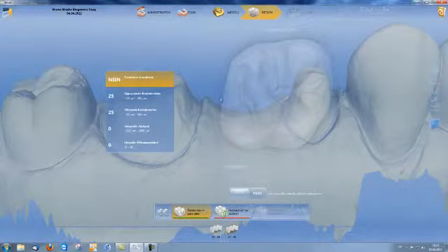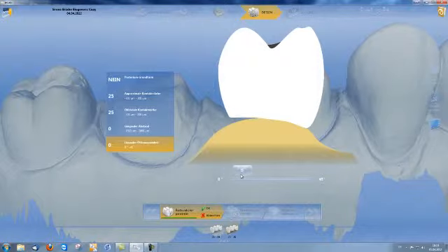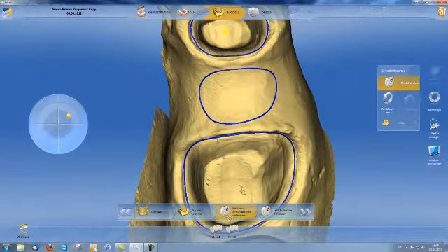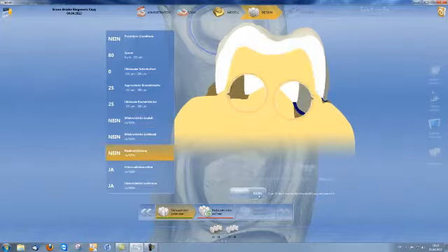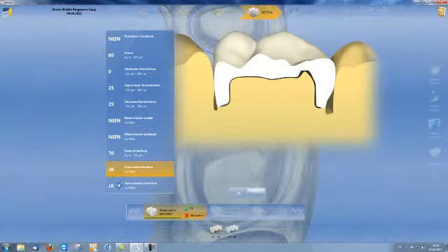In the parameter mode, I am able to set the parameters for my pontic, i.e., my occlusal and proximal contact strengths, the pressure on the gingiva, and my lingual opening angle if desired. The same applies to tooth 24. For the fit of the preparation, minimum wall thickness as per the material manufacturer's recommendations, margin reinforcement if desired. Milling radius correction for a direct fit and to block out undercuts.